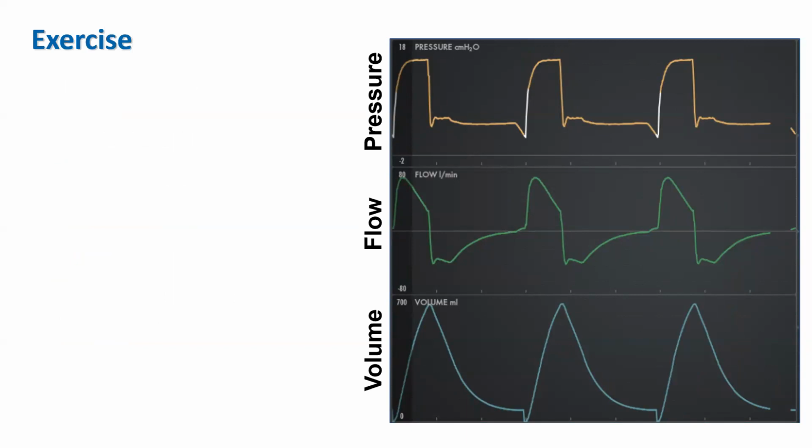Okay, here's another exercise. What do you think about this? Well, start with the tag. Again, it appears to be pressure control. Every breath seems to be mandatory, and there's nothing automatic happening, so we'll call that set point targeting. What's the load? Well, not much is going on during inspiration. Not much is going on during expiration.